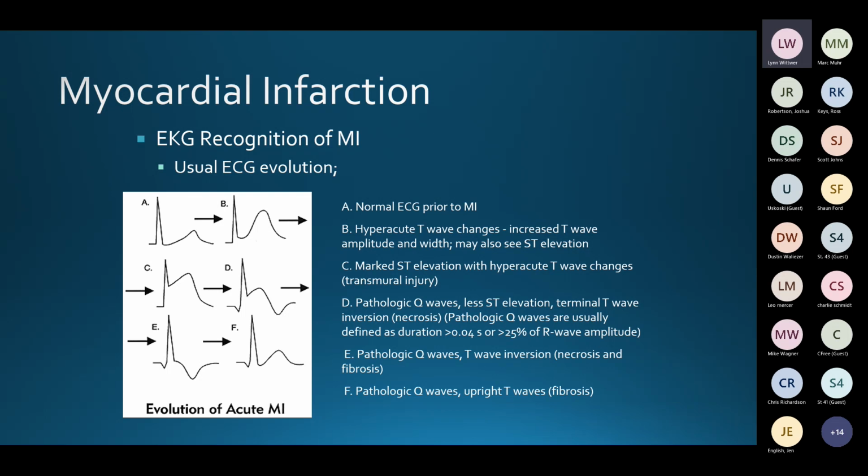So here we have a normal, and then as you start getting into an actual myocardial infarction or STEMI, you'll start to get a rise in the ST segment.